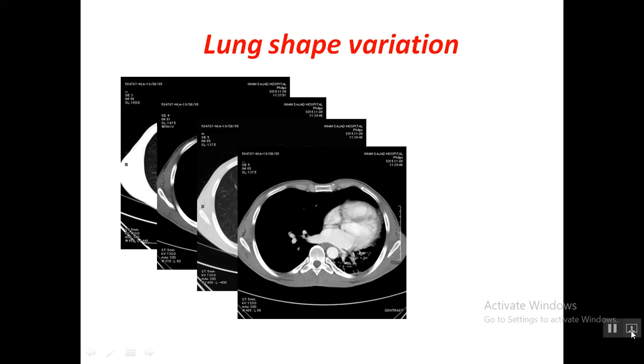But as you know, two other terms of lung shape are horseshoe lung, which is a congenital finding that we expect to see in the pediatric age group or in low age groups, which is demonstrated by midline migration of the lung, but posteriorly from the right to the left side, and is not proper for this normal variation that I showed here. And the other term to keep in mind is compensatory lung growth, which is another term, and I won't go into it.